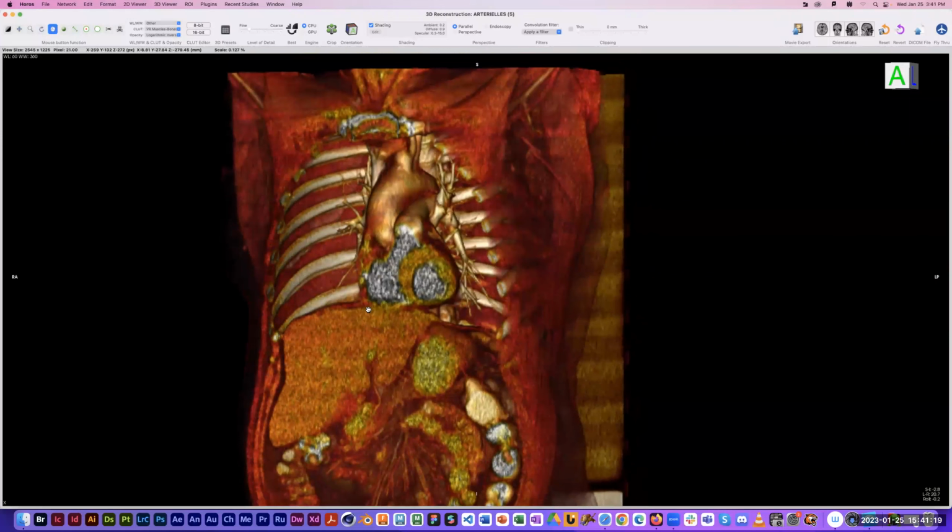All right, so now that I've quickly shown you the crop tool, now let me show you this color lookup table editor, because I think this is a good view to demonstrate what the color lookup table editor does. So I don't normally click the 8-bit one. I click the 16-bit color lookup table editor.